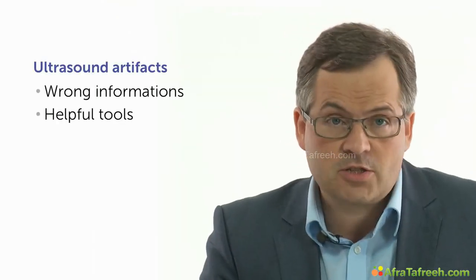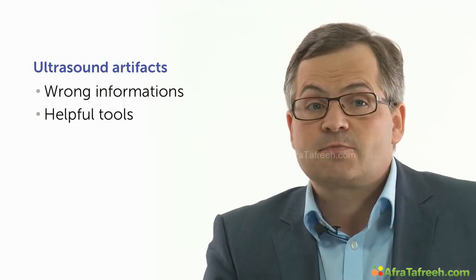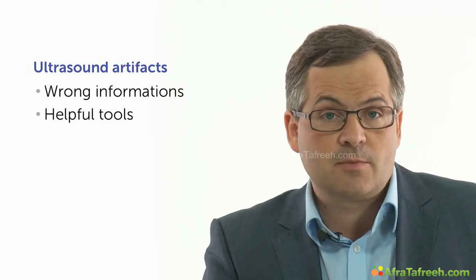As I already said, artifacts can be friend or foe. They give us wrong information on the one hand, but can also be helpful tools to recognize special pathologies or distinguish them on the other hand. Let's make friends with them and use them for our benefit. We are going to tell you how to do it.